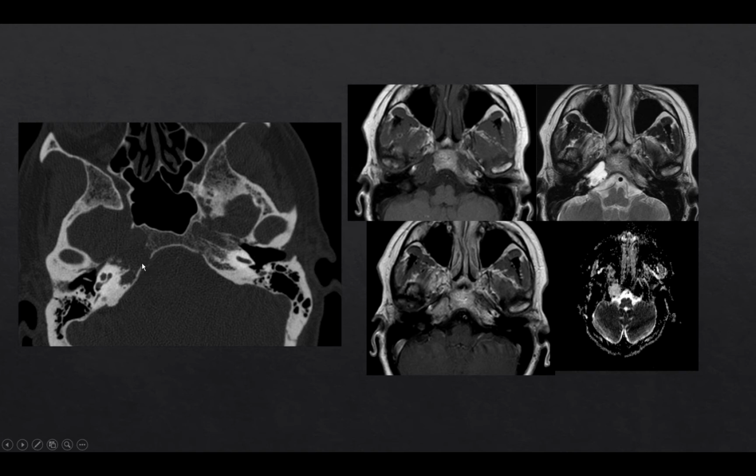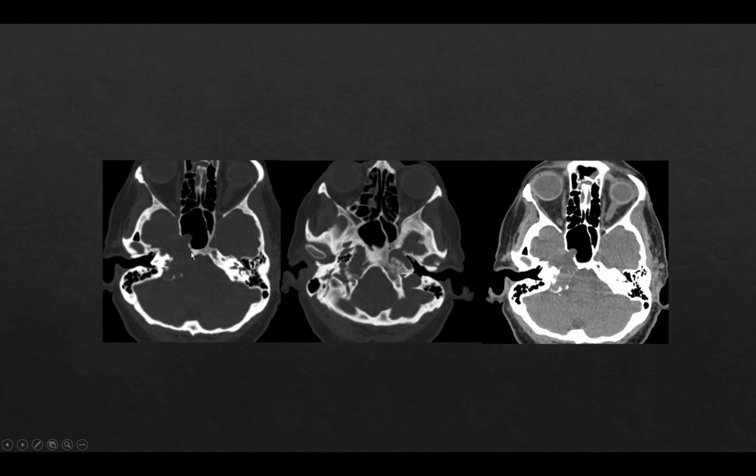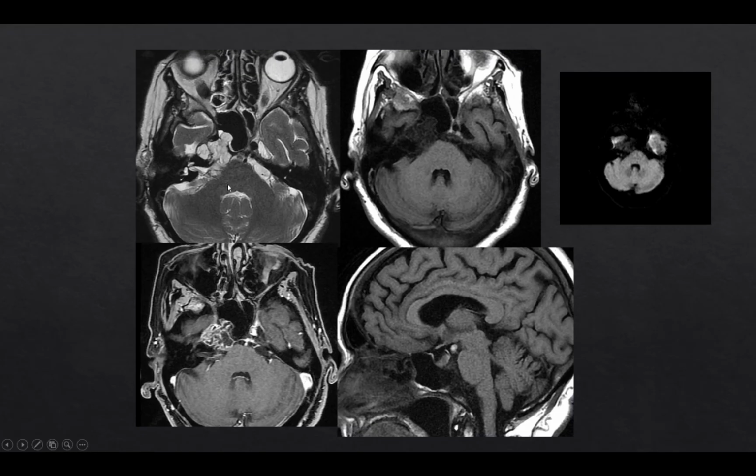of a synchondrosis. Here we see an expansile lesion of bone centered within the right petrous apex, involving the petroclival fissure. So this is also a good candidate for chondrosarcoma. But this lesion also involves the clivus. There's actually a sclerotic component involving the clivus with a broad zone of transition, and this happens to be a chordoma. And let's look at the MRI features, which can help point us in that direction as well. Chordomas tend to have a lacy appearance, or some people describe it as a honeycomb appearance, with different cavities circumscribed by hypointensity on post-contrast imaging and T2 weighted imaging.